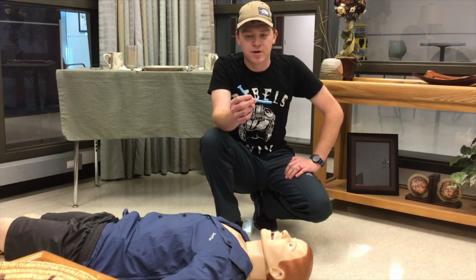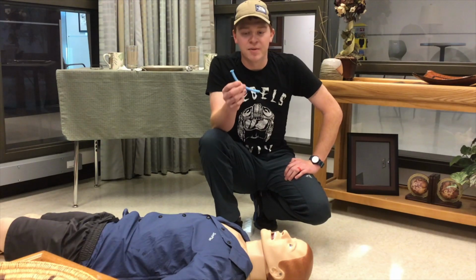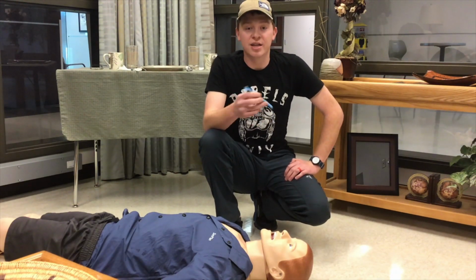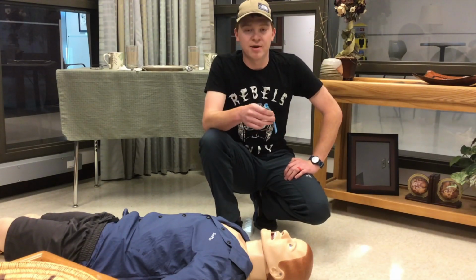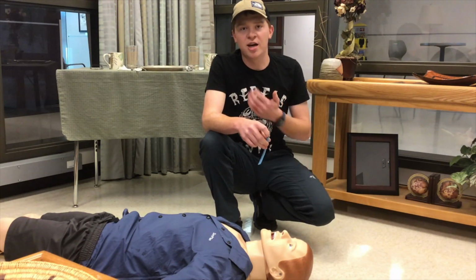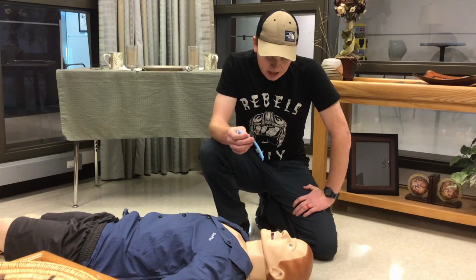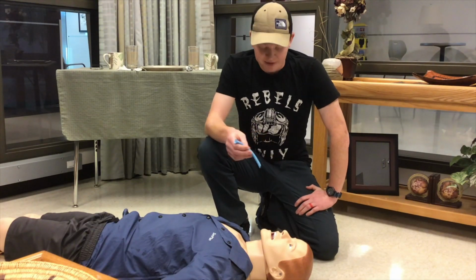All right, so I'm going to be going over briefly the nasal pharyngeal airway, otherwise known as the NPA. We're going to go over first a couple of the indications for the NPA. Essentially, the biggest indications for the NPA would be times that the OPA, or oral pharyngeal airway, would be contraindicated. Times such as trauma to the jaw of the patient, or potentially you can't get the tongue out of the way to get that OPA in, as well as a patient with a gag reflex, as these will not affect the patient's gag reflex.